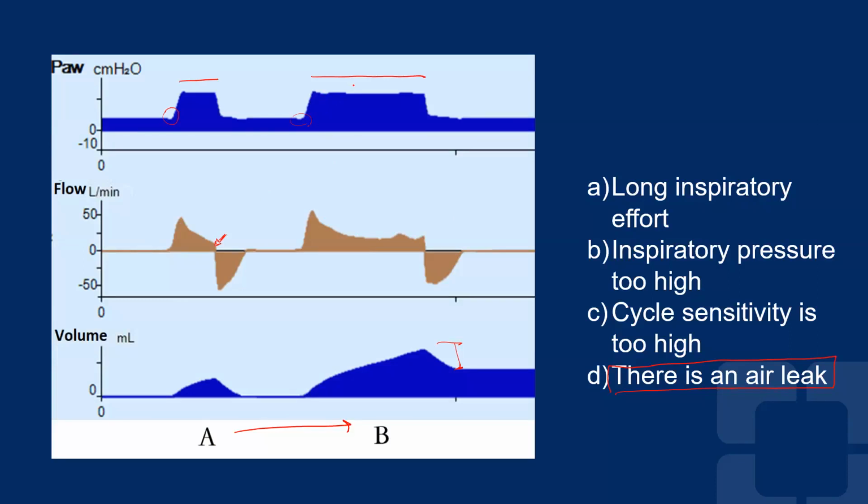You can see how a passive waveform, this one, finally the patient was exhausted, I guess, couldn't do it. And then you can see this is a passive exhalation. That's how it would look. So each time that it approaches the baseline, that's an attempt to inhale. If it moves away from it, it's an attempt to exhale.